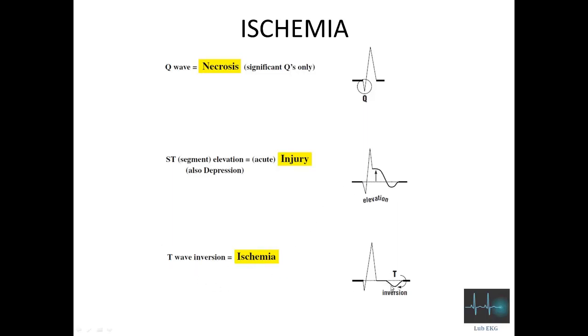T-wave inversion, as seen here, is simply ischemia. The cardiac tissue is insulted by lack of oxygen or blood supply, but is not dying, it's not infarcted.